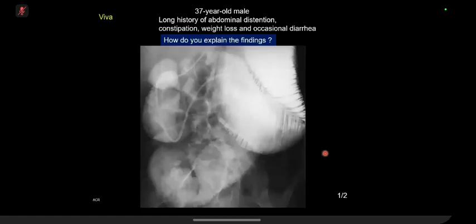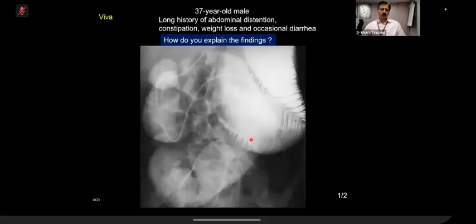So the bowel appears to be significantly dilated and folded in together with multiple folds, with a smaller distance between them. The bowel also appears to be of larger caliber than would be expected. And I think I can see some sacculations in the right upper quadrant. Okay, what is your conclusion? So the appearances are typical for scleroderma.